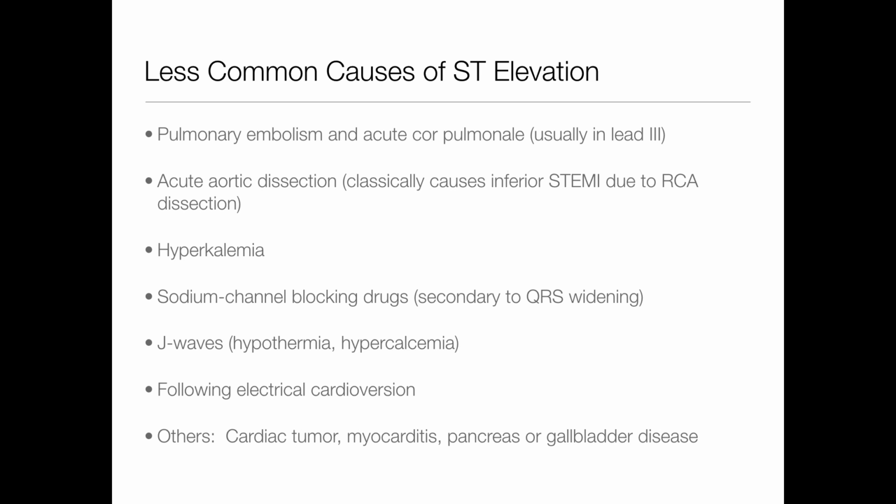And hopefully during this lecture, you begin to narrow down the possibilities by looking at the ST morphology, other things that are going on the EKG, how much elevation is there, what leads do you see it in, are there reciprocal changes, what does your patient look like? These are all things to consider.